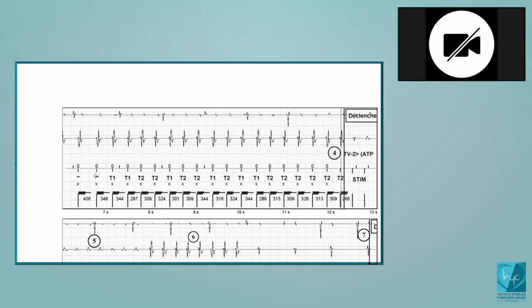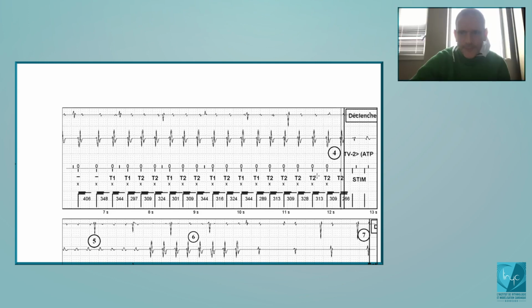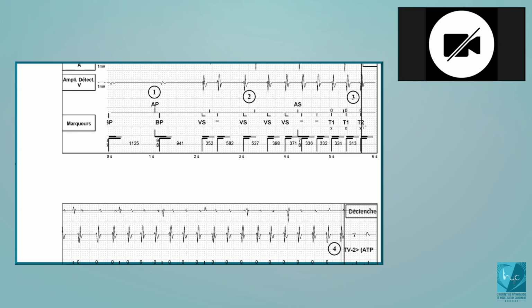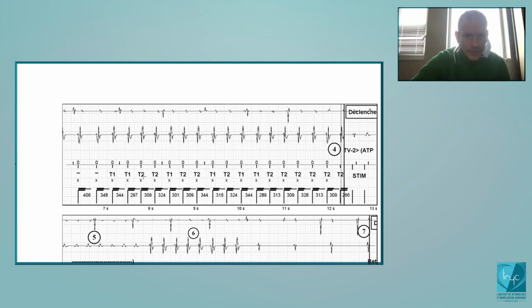2, 2, 3, 4, 5, 6, 7. Okay. Now for the T2. T2 here: 0, 0, 0, 1, 1, 1, 2, 3, 4, 5, 6, 7, 8, 9, 10. Okay, so as you see, the counters are completely independent. It means that a T1 will not decrement the T2, and the T2 will not increment the T1.